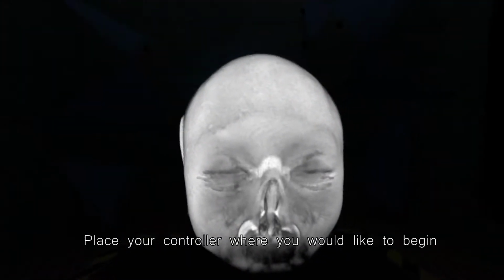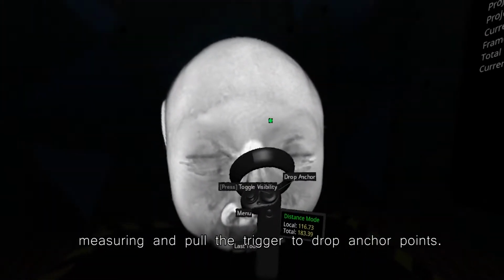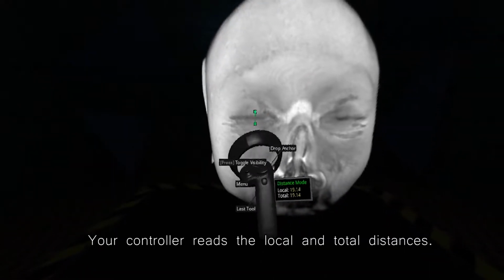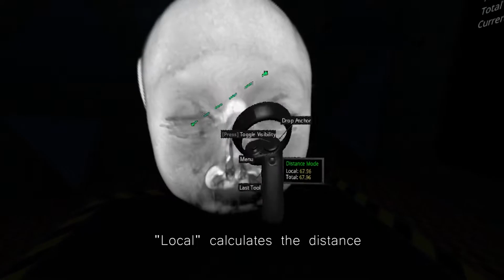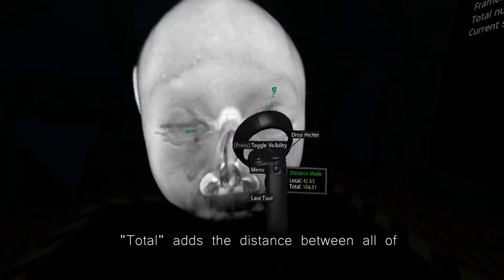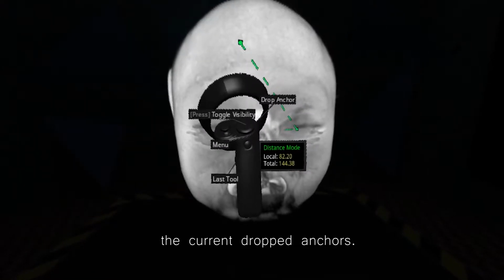Place your controller where you would like to begin measuring and pull the trigger to drop anchor points. Your controller reads the local and total distances. Local calculates the distance from the last anchor in real time. Total adds the distance between all of the current dropped anchors.